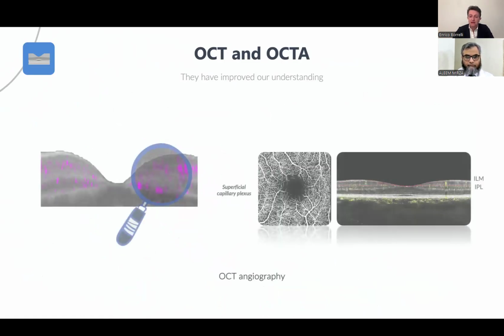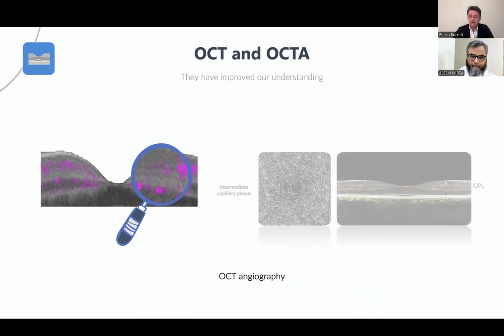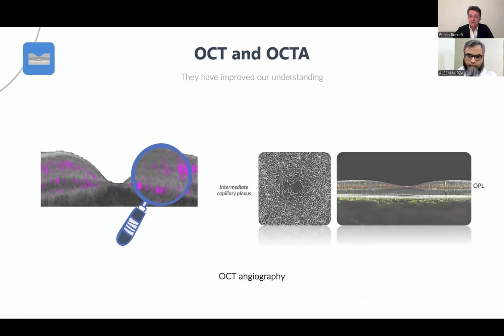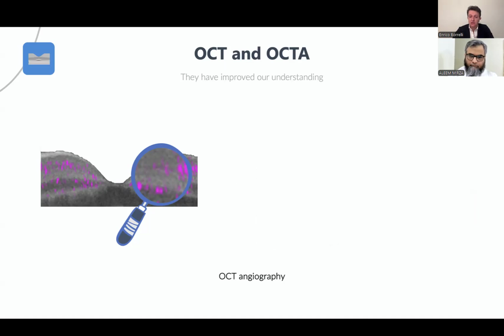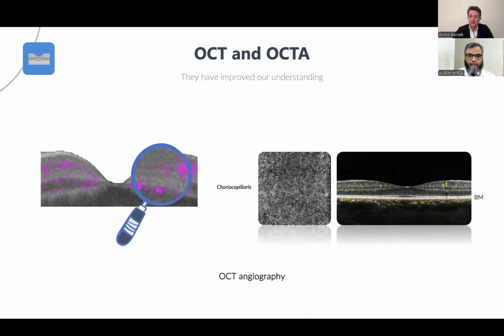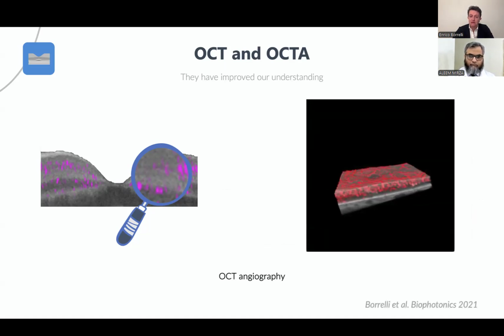Using OCTA, we may also be able to differentiate the retinal vessels at the different depths, and also the choriocapillaris may be investigated using this technology. This is a three-dimensional visualization of the retinal vessels in normal patients.